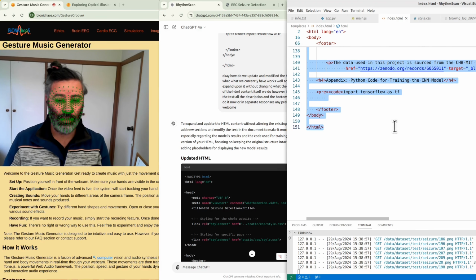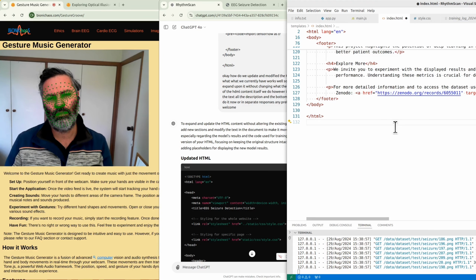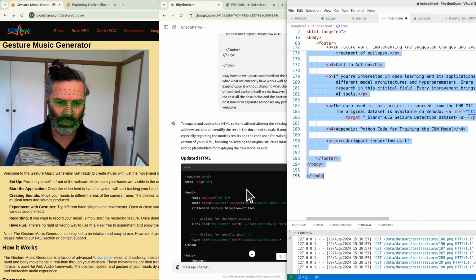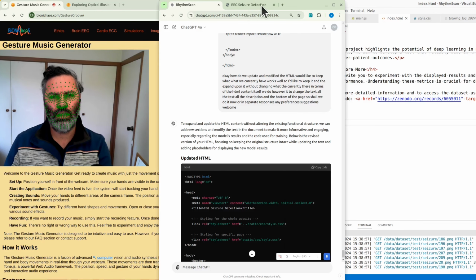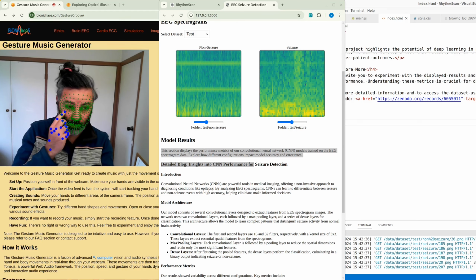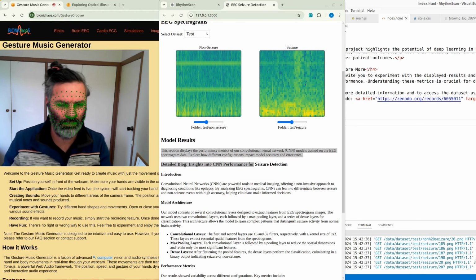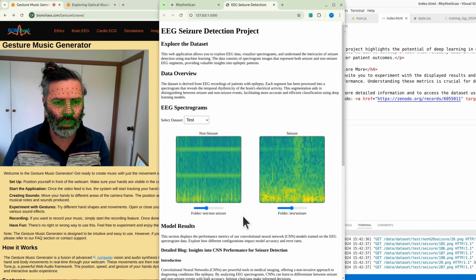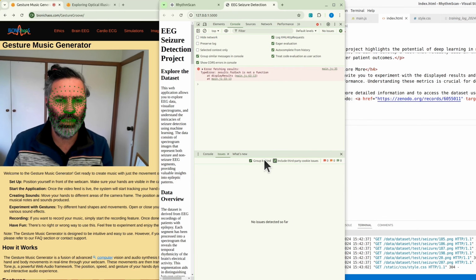And we currently have 150 lines of code, and then 131. What did we get rid of? Yeah, we have 196. Well, okay, I think it cut the description to be a bit shorter, but I don't see the results on the page.